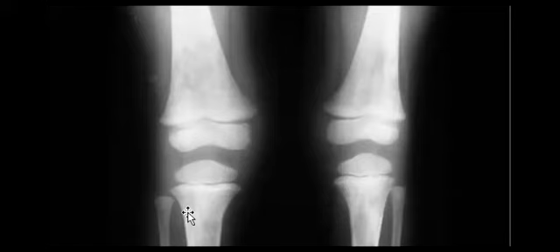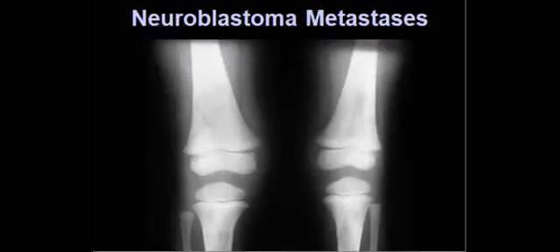Yeah, if I told you again that this patient had primary, so what could it be? Leukemia. Perfect. But leukemia will be infiltration. But I told you that this patient had primary, what will it be? Maybe neuroblastoma? Yes, it will be neuroblastoma metastasis. Perfect. So they can show you everything. Okay, agree?